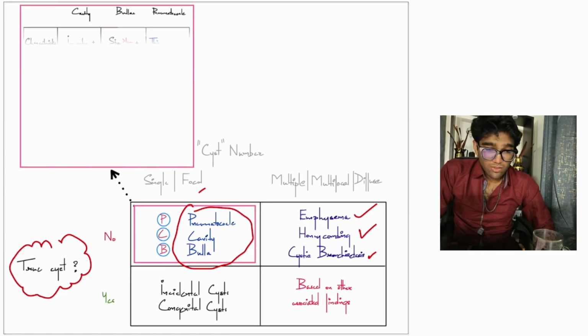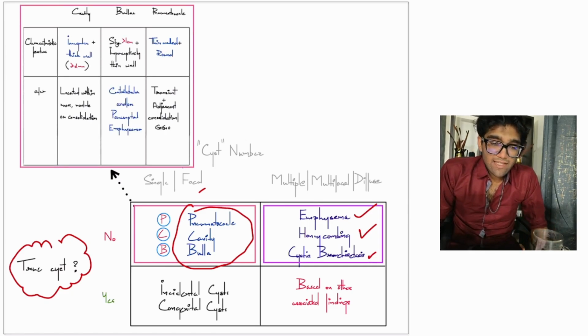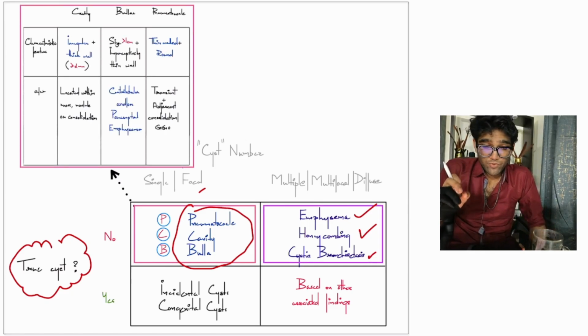We will do a comparison. A cavity has a thicker wall. A cyst by definition has a perceptible but very thin wall, usually 1 millimeter. Whereas a cavity has a thicker wall of 2 millimeters or more, and usually because it is thick, it is irregular. So it's an irregular and thick wall.